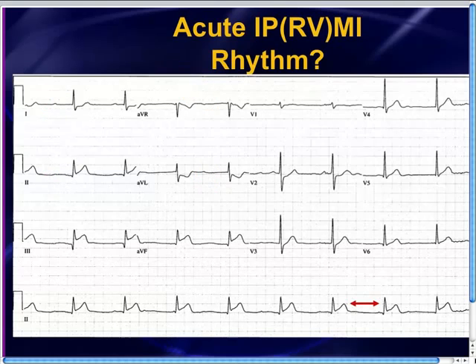All right. Next step, what's the ventricle doing? Well, the ventricle is beating in the 50s, and these are narrow QRS complexes. Therefore, it's not a ventricular rhythm. It is either an atrial rhythm that's being conducted, or it is a junctional rhythm, right? Because atrial rhythms and junctional rhythms are narrow. So this is some type of supraventricular rhythm, meaning either atrial or junction. Supraventricular rhythm, it's narrow complex, and the rate's going in the 50s. So we're happy with that. 50 is just a tad bit slow, but not so slow that we need to do anything emergently for that.